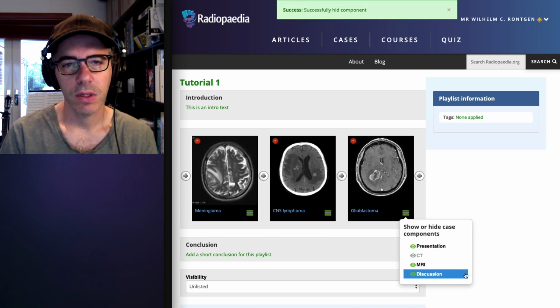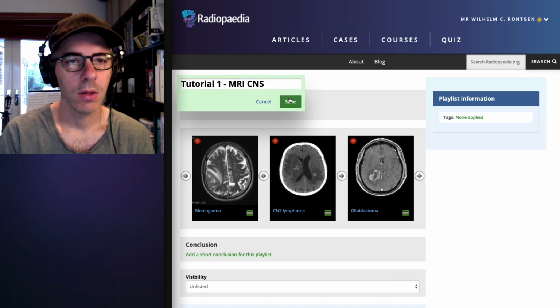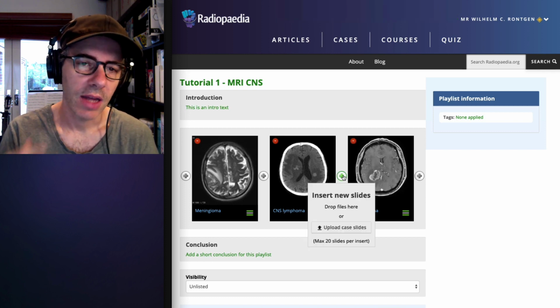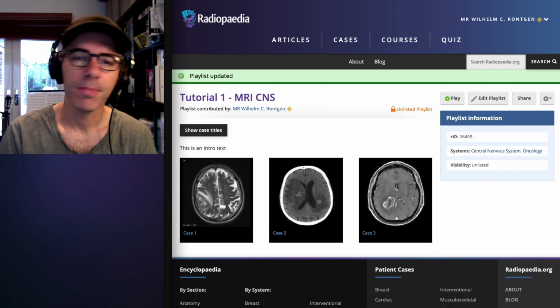So here it is. We'll change this to Tutorial 1, MRI CNS. Now, if you wanted to, you can add images or slides between the cases, but I won't show you how to do that now because it's really not necessary for tutorials. Once you've finished editing, your playlist is ready to go.